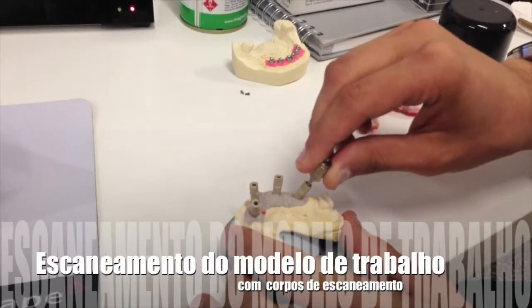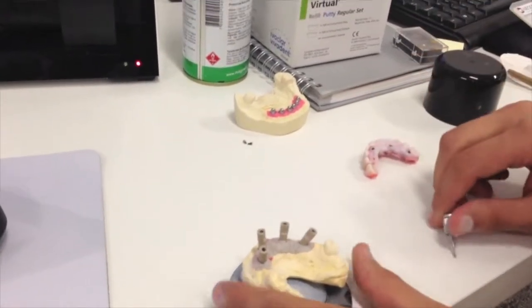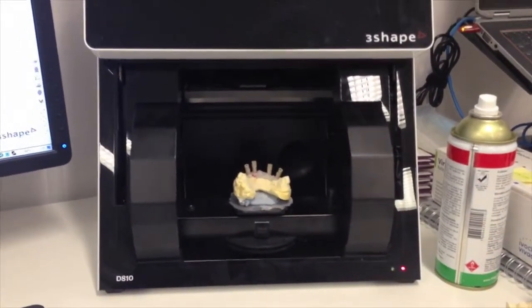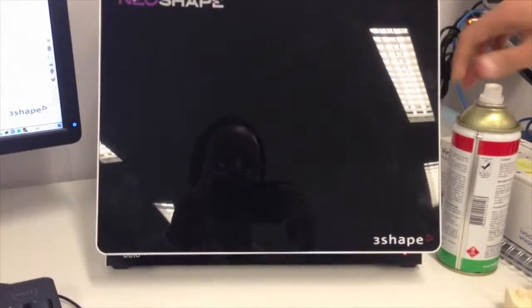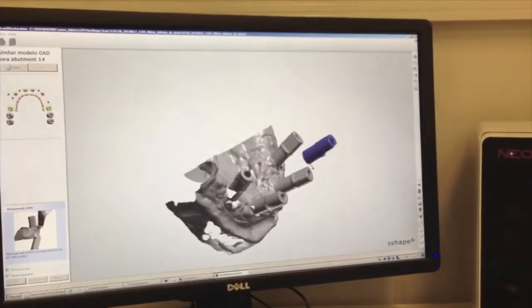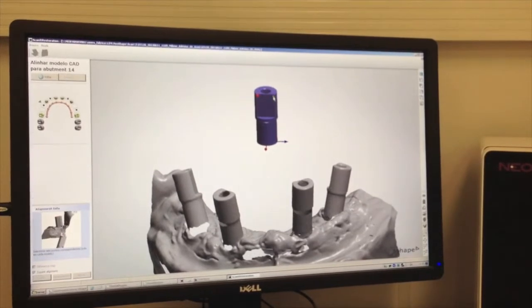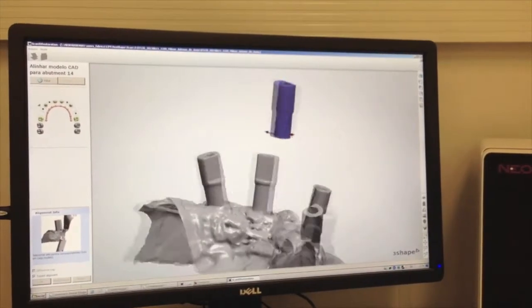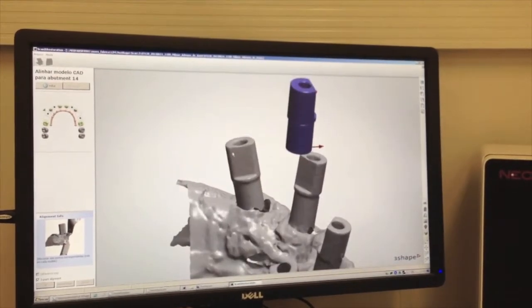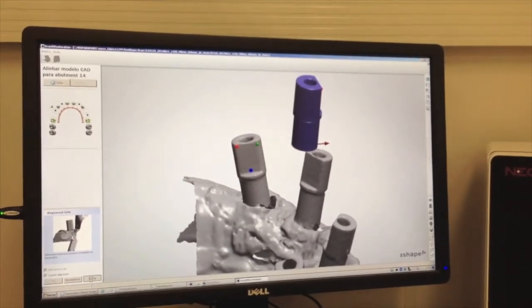The prosthesis is removed, and on the abutments or implant analogs, special transference for digital capture are screwed. These are made of a material that facilitates scanning with the same geometry as digital transference present in the software. One by one, they are superimposed on the scanned transferees by marking 3 points in the space and organized by 3 axes, X, Y, and Z.